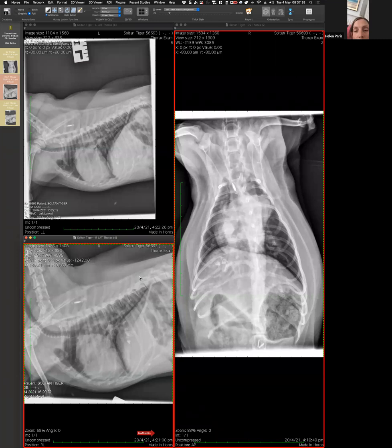Yes. And then can we think about options? Because actually, the way that I should have framed that is that what we are seeing is a constellation of evidence of pulmonary hypertension. It seems that the problem is at the level of the lung that is resulting in a right-sided hypertrophy. Make sense? So enlargement of the ventricle and the pulmonary outflow tract.